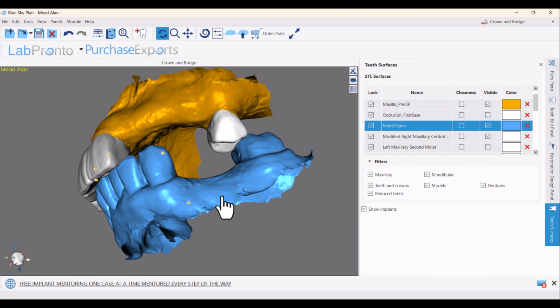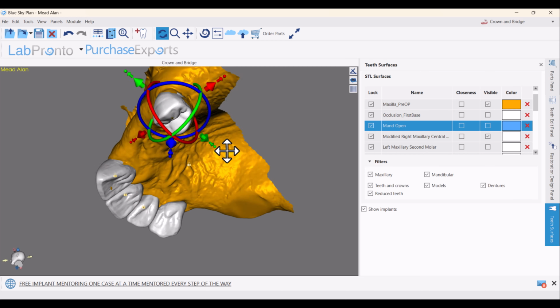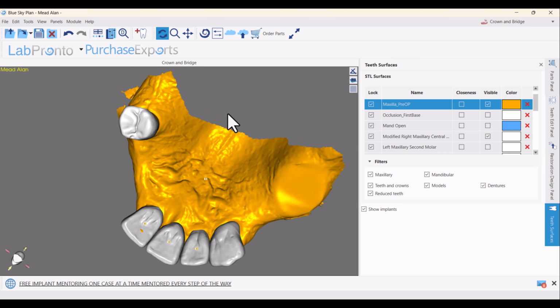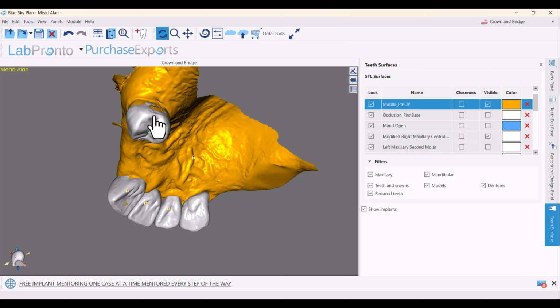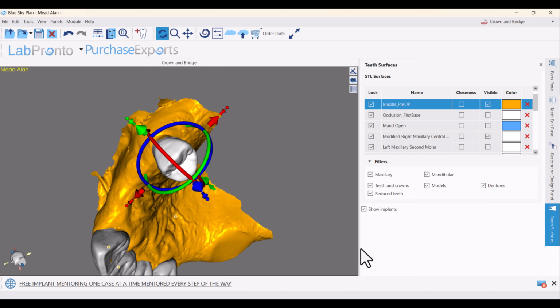This here gives Alan a lot of room to work with. I'll cover this whole palatal cusp if he wants to. Now he wants to rebuild the whole tooth out of composite with injection molding. Obviously, he might or might not. I don't quite know. Because he's going to have to build back up.